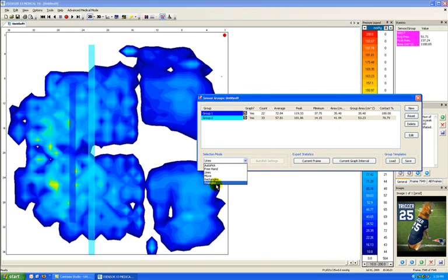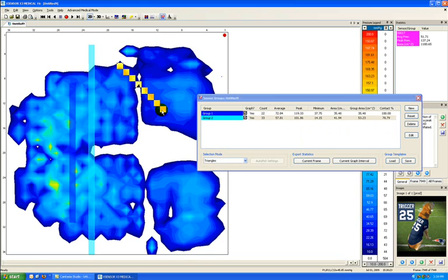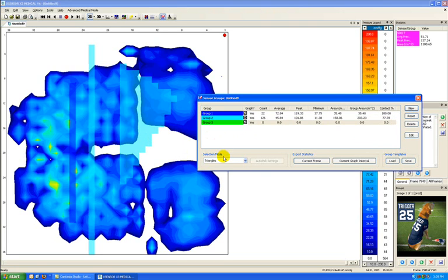So let me show you the other views here that we can use. Triangles. So clicking and then defining a triangular area by letting go and then clicking again, I can get a triangle of area. Again, that will tell me what that group is. Moving further, I can select one by one. So I could actually select cells in a different area to be included in a group. So if I wanted a sampling of different cells, I'm able to do that by clicking on different areas.